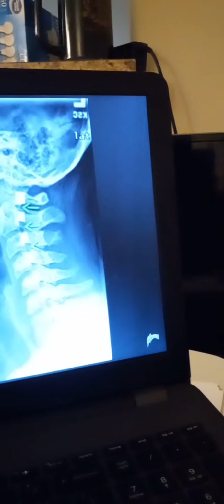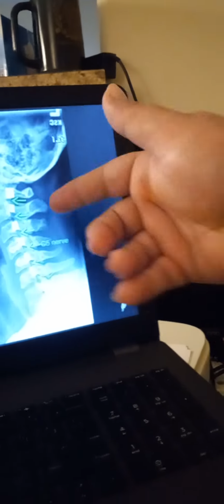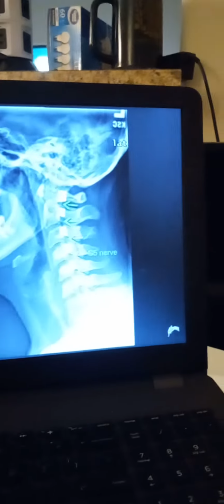Adjacent vertebra. So there's the C4 and C5 vertebra. So the nerve that comes out is the C5. And see, theirs is perfect, the facets are fine, but my facets look jammed, right? Kind of down too, right?